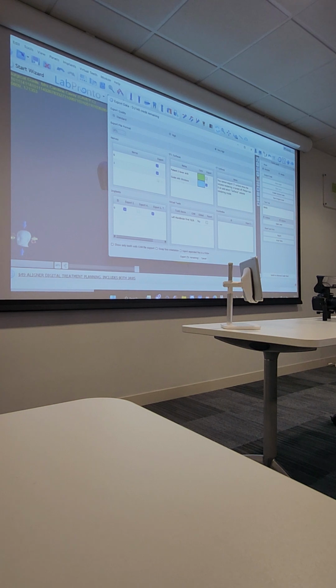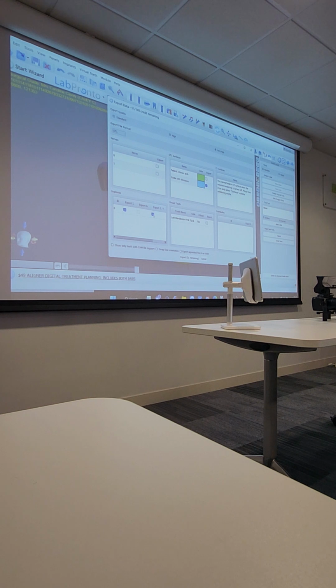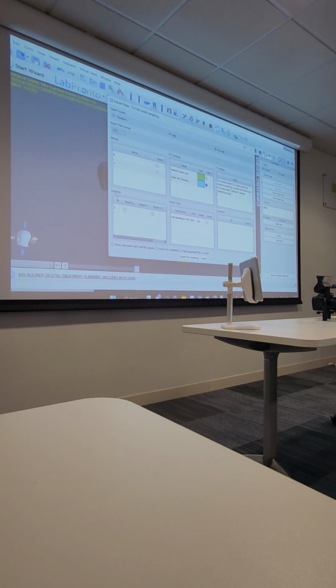I don't want to. You can export the nerves. Don't want any of that, so I untick everything. I don't want to export the position of the implant. I purely want to export the guide with my window. Color coding helps. I know it looks blue, it's blue here. Export here. Okay?